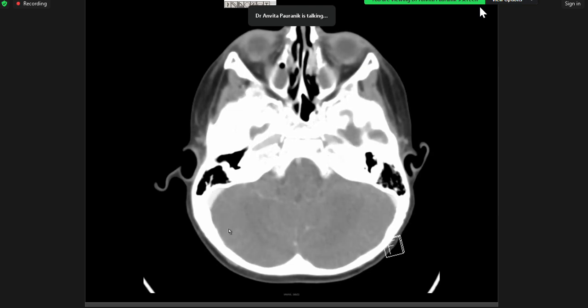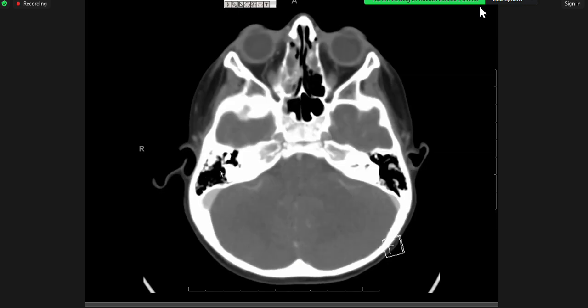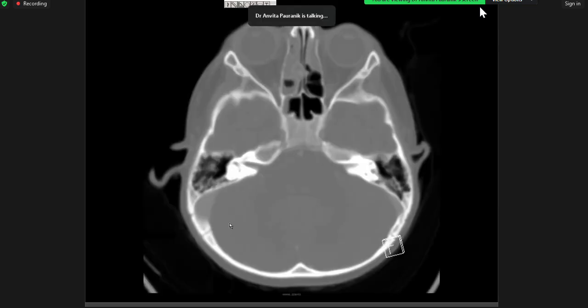So if you were to see mastoid opacification, you need to just make sure that there is no external swelling, make sure that this, what is the structure here? Sigmoid sinus. Yeah, make sure that the sigmoid sinus is fine, right? And it's just a little bit of incidental opacification, and we are not dealing with mastoiditis in any other example, not this one, of mastoid opacification.